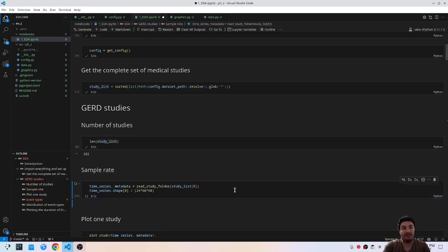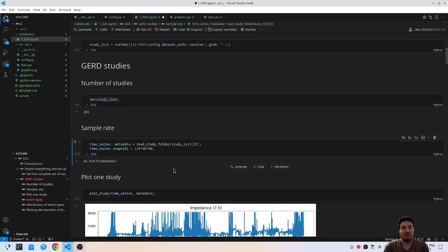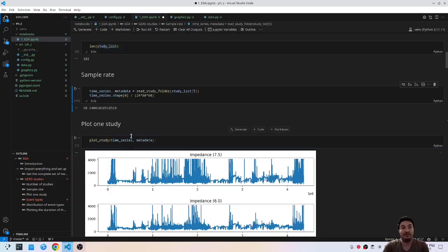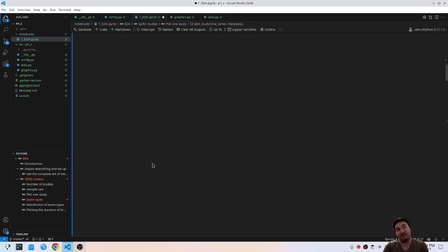Probably if I can change here, it will be similar, but not close number, around 45. So I choose 44, closer to 44 than 50 actually. Okay, but more or less is what we saw the other day. We can see here, it's going to take a while.